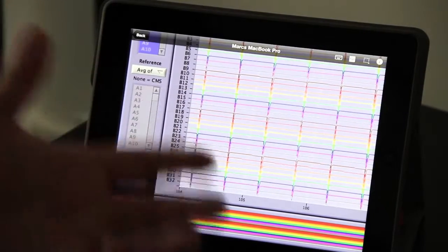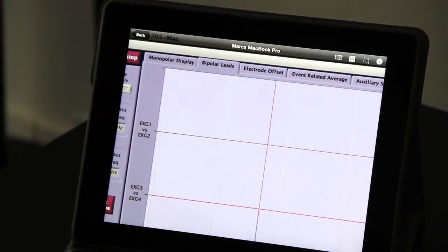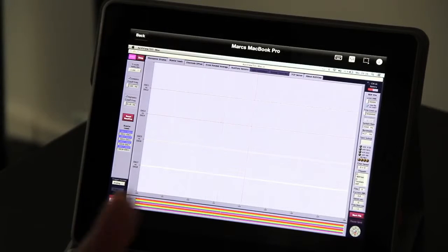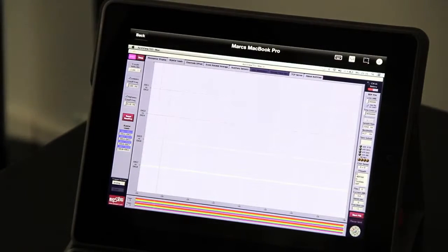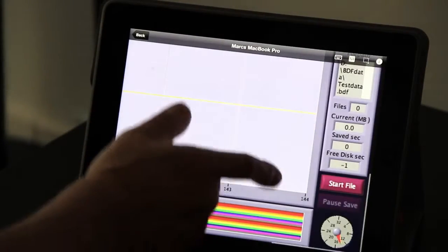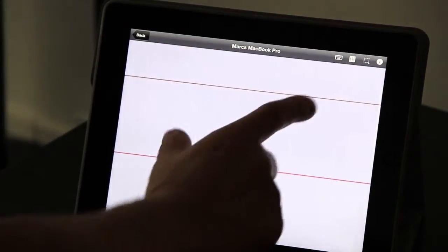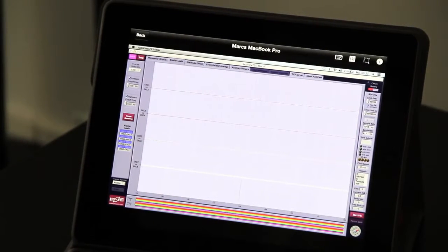If we have fingers like I have, we can too, because then the buttons are a bit bigger, so we can toggle easier to the next button itself. So that's all very, very nice. So we have complete functionality, including zooming in, zooming out on an iPad, obviously not on an iMac or a MacBook Pro at the moment, because there is no touchscreen. But on the iPad, it's all very beautiful. We can zoom in, we can check all the things in complete detail, and that's, I think, a very powerful and very beautiful feature that we can run.